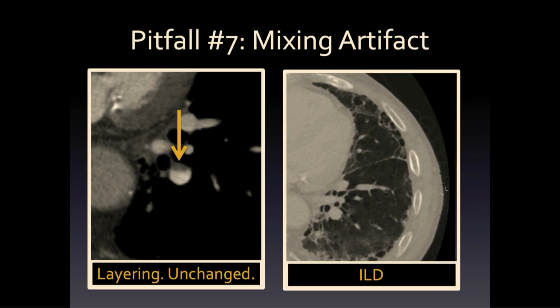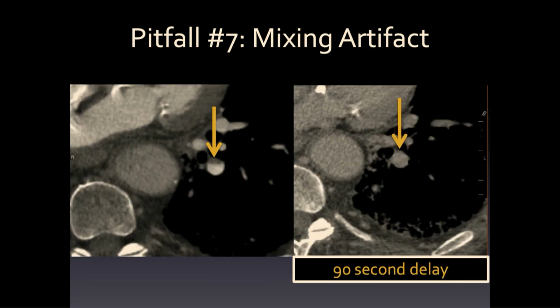There's also a reason to have abnormal flow of blood. This person also had an ILD. At some point, some expert-level person, not me, brilliantly said, hey, maybe this is actually a mixing thing. And so at some point they added a delay to a PE study. It actually was homogeneous and filled in. And this was slow flow and mixing because of that ILD.